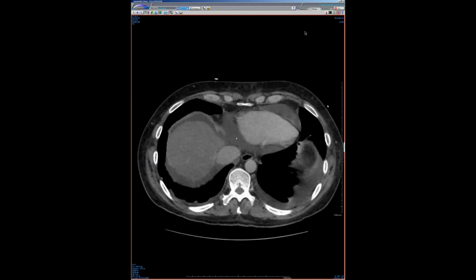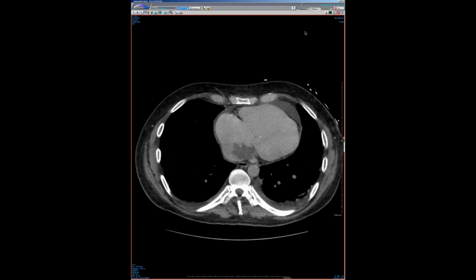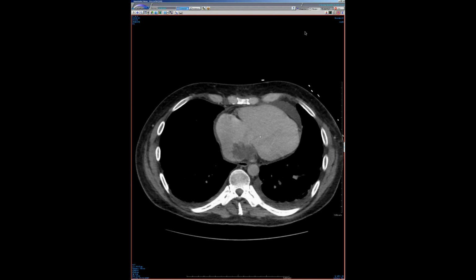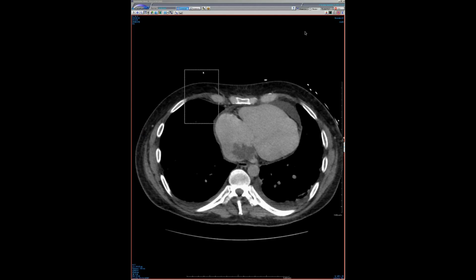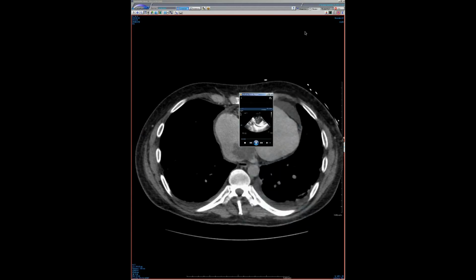He's got ascites, and they showed me this, and I said, well, he's not a drug user. I mean, you can always think of the vegetation, but I thought this was going to be a myxoma. It's very frond-like, very lobulated. Still could be a clot, I guess. Let me just make sure there's no PHI on this. I don't see any, but I'm always wrong about it. So you can see this thing kind of flopping around in there. Let me show some other pictures where you can see that this thing is not a clot.